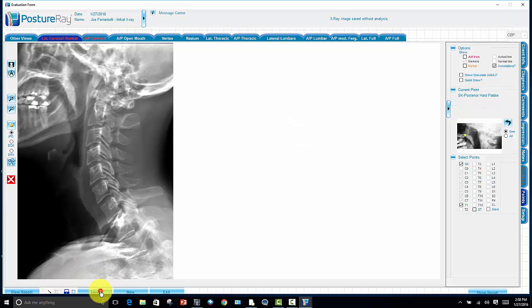I'm just going to go ahead and hit save. Those are in there. And it tells you off to the side what we're going to hit. In the very beginning, we're going to uncheck the skull markers. That's more advanced. And we're going to just start where it tells you here. So keep an eye on here, and it's going to tell you right through here what's going on, okay?